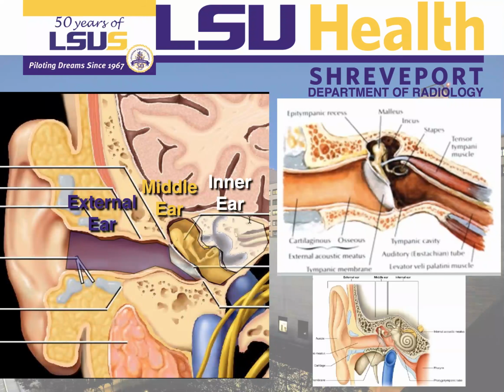Okay? Here is another image showing the eardrum or tympanic membrane as you wish, the ossicles, and the muscle, the tensor tympani muscle. It arises from the Eustachian tube and attaches to the malleus in the intersection between the neck and the handle of the malleus.